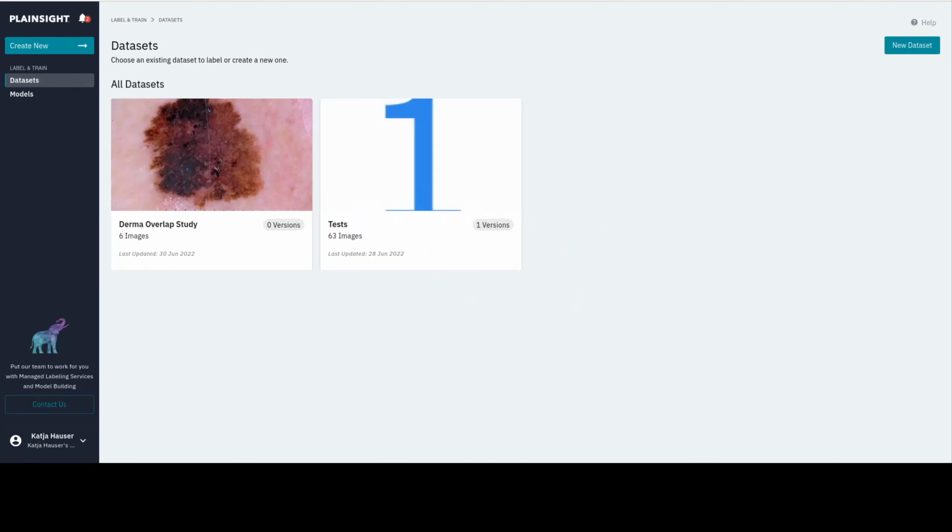Hi, thank you very much for participating in our study on the overlap of human and machine explanations in dermatology. In this video, I'll explain to you how to use Plainsight.